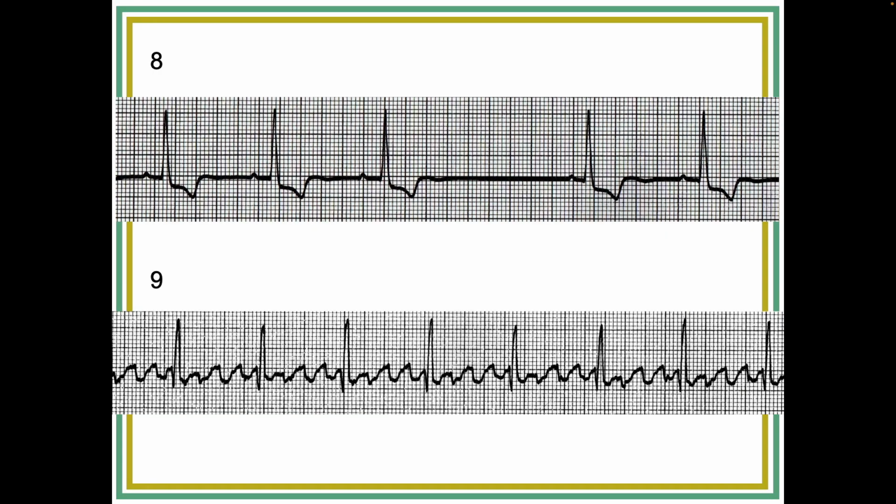Okay. And last one, number 9. So it's a regular rhythm. So regular. It's about, what did I say?